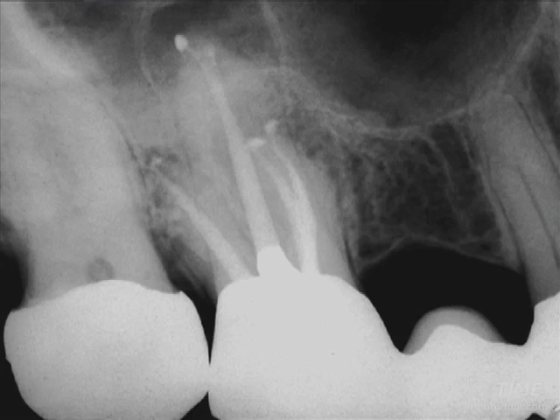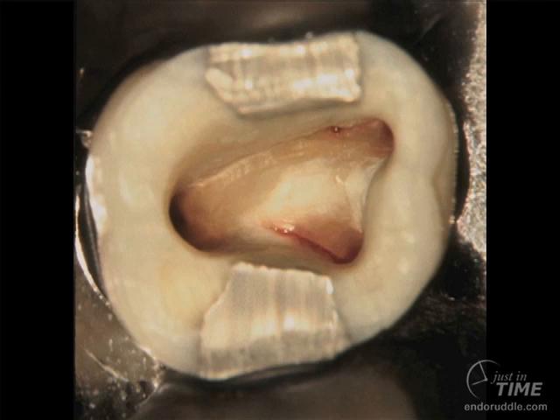Here's one example, a molar posterior bridge abutment where the MB1 and 2 are separate, and they do exit in two or more separate portals of exit. This is a good sign if we're trying to set this molar up for a long-term result. Now, in another segment, I've talked about the 17 ways to help you identify calcified canals, aberrant canals, or in the retreatment situation, previously missed canals.